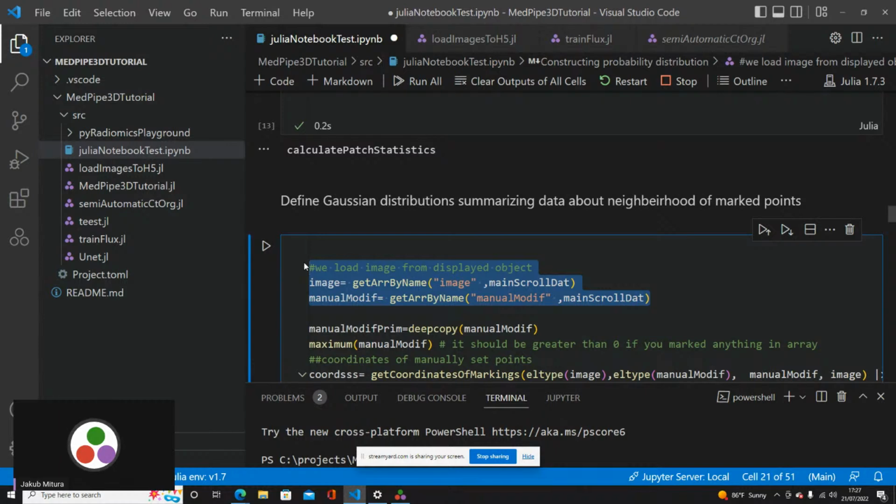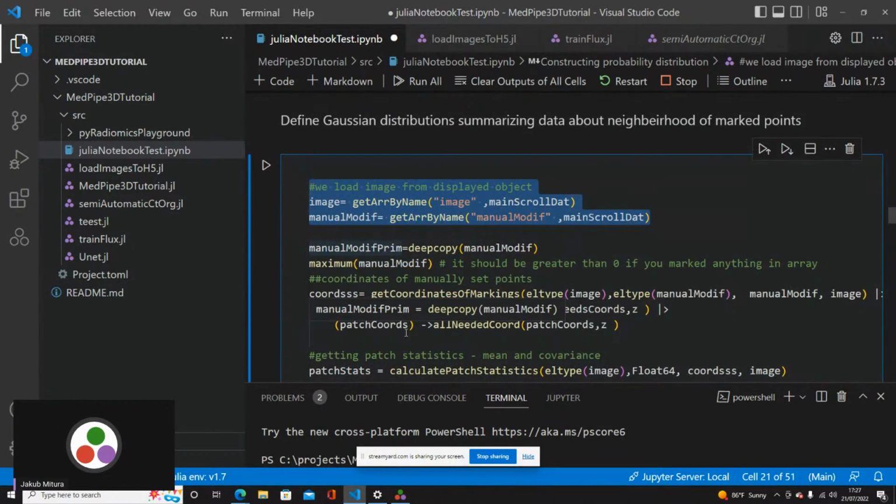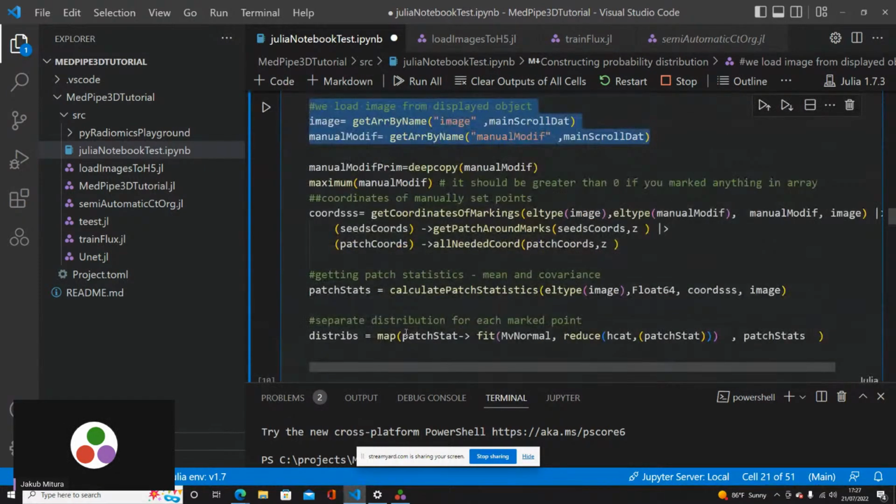You cannot modify it on the fly in most cases. There are some exceptions. There is Napari, which is also a very good tool, but in many cases it's very hard to achieve. And now it's also possible in Slicer notebooks. Anyway, here it is very convenient, at least in my opinion.